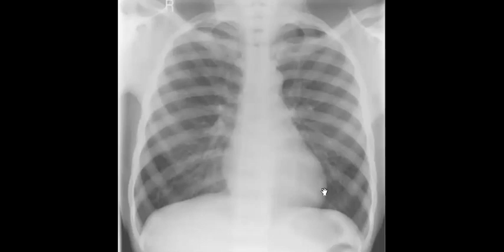So what is missing here in your checklist? You will find it. You try to find the big title. Yes. So ribs. What you want from the ribs? Inferior notching.